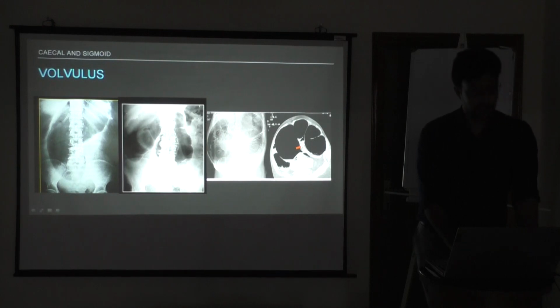So like I said, this is a C-shaped cecum, and this is also cecum. The reason why it is the other way around is there are two types of torsion in cecum. This is axial, and this is transverse axis, it gets rotated on. So this is also cecal torsion. But for surgeons it is important to understand whether it is cecal torsion or sigmoid, because the incision depends and you have to tell the patient's attender whether it's an ileostomy or a colostomy.